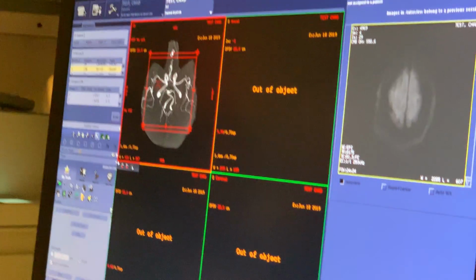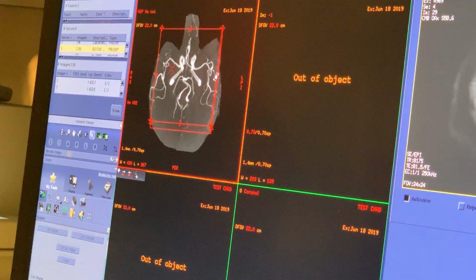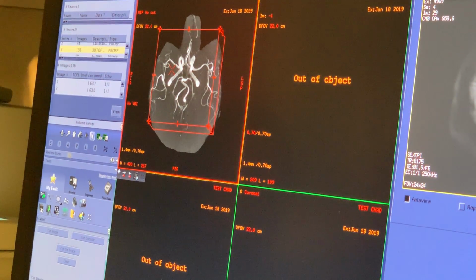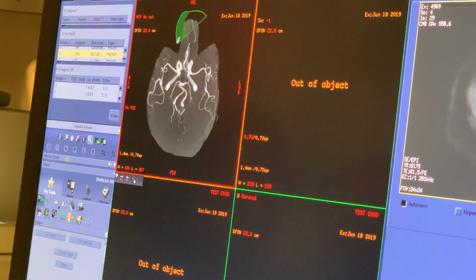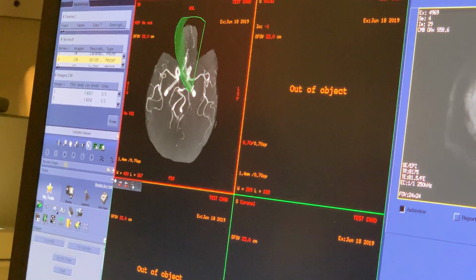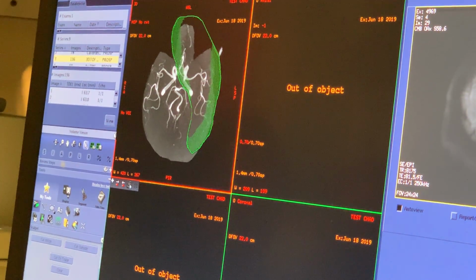Same thing as before, I'm going to tip the brain forward a little bit. I also need to get through right here, so I might actually angle it just a little bit that way to buy myself a little bit of extra space in there. Okay? And then I just go ahead and circle around again. Cut gently right through there, come right through there, cut right through that PCOM perfectly. Get rid of that, whatever that is.